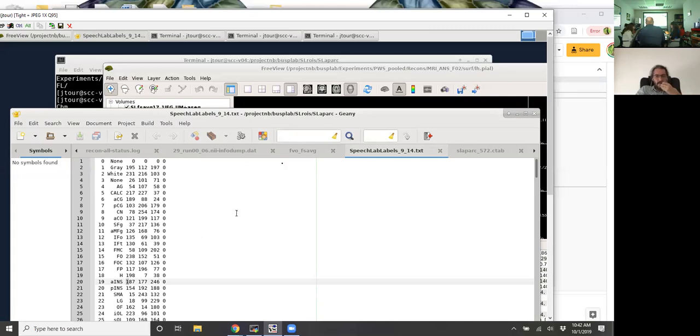So that just causes confusion. But I don't know if it's worth it to load MATLAB and show you. I think it's okay. One of the things I did want to tell you about as I was getting ready for today, I realized that we have these scripts. So I feel like we're at the point where I'm going to talk about a script that opens stuff in preview, but we move off. But the color table thing is pretty key because you end up using that.